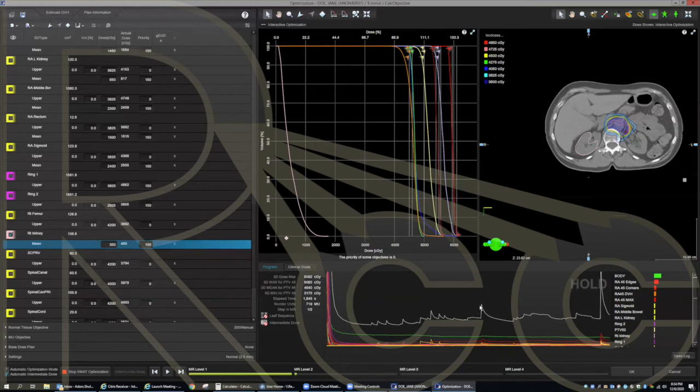But I would do that fine tuning of those optic structures just basically in step 3, because again, small movements of the MLCs can finally carve out little bits of dose, say around the optics, while keeping dose on the PTVs. So a lot of that step 3 is just for fine tuning dose around small structures. Same thing, I might have a really hot brainstem or a spinal cord, and then in step 3, I'll just fine tune it, and I might drop it 7, 8, 9 gray max dose just by fine tuning of MLCs without affecting PTV coverage.